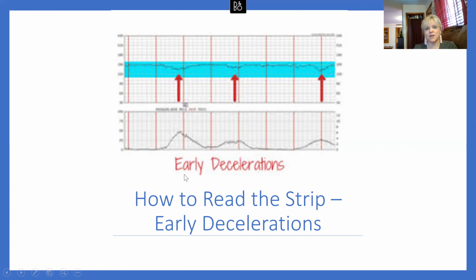of the contraction. What's happening here is a vasovagal response, because the fetus's head is being squeezed by the contraction. Pressure on the fetal skull changes the cerebral blood flow and stimulates the vagus nerve. The heart rate will generally, gradually increase back to normal as soon as the contraction stops or decreases. Early decelerations are usually benign. They're usually not associated with fetal hypoxemia or acidosis.